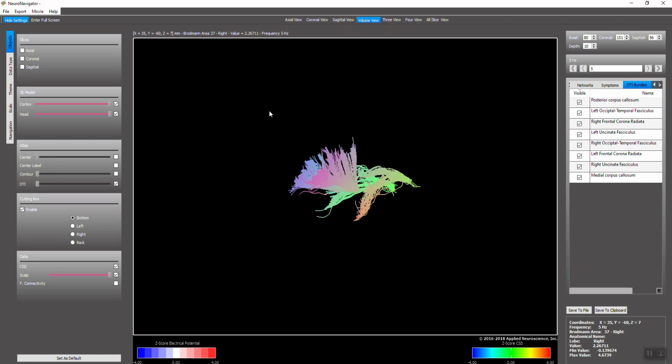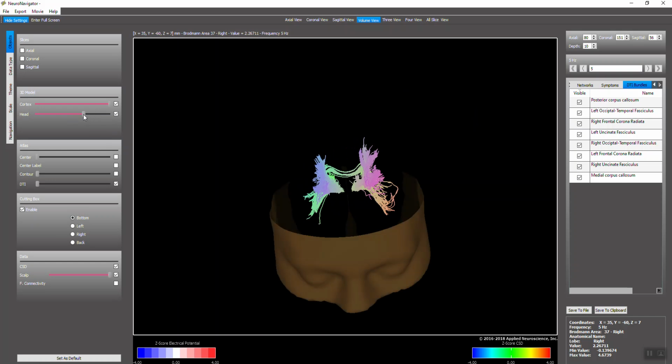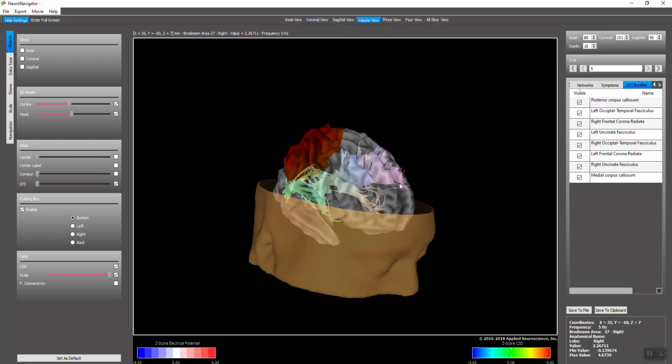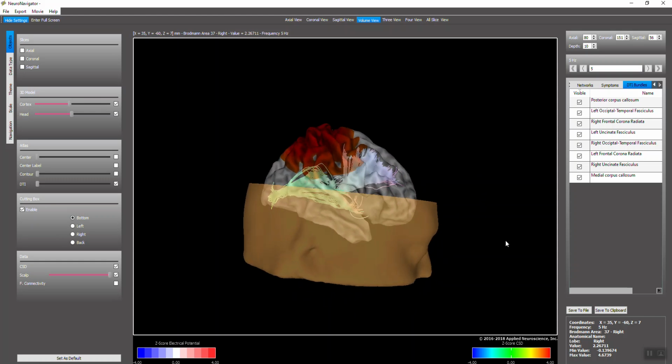So there's a lot of tools in here to explore, to be able to evaluate different aspects of the brain in patients with different problems, and link the patient's symptoms to dysregulation in hubs and nodes and connections between network hubs and nodes.